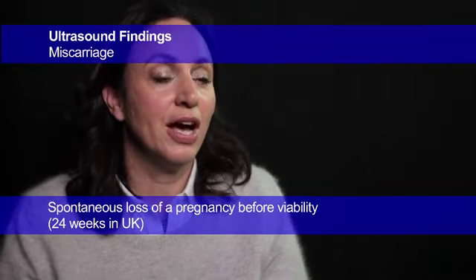So what are the definitions in early pregnancy failure? In the literature, as I've described before, we see terms like blighted ovum, missed miscarriage. I would urge you not to use these terms and to simply refer to early fetal demise or early pregnancy failure. I will just describe the features so that we all understand what we're referring to here.